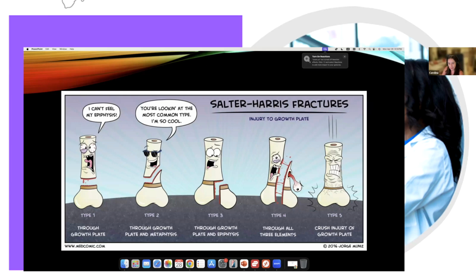Now we went through the hip, the knee, and the ankle. These are the most common injuries. Of course, we're talking about plenty other injuries around, things that you would assess with MRI, ACL, PCL, menisci, all of these things. We would see them much better with MRI or at least with a CT, but what we're doing here today is trying to really assess fast and hard with radiographs.